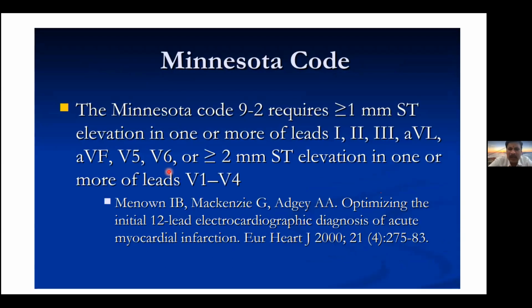So how do you take a diagnosis when there are chest leads? When the ST elevation is more than 2 millimeter, it is significant, right? Another carry-over message: in chest leads, more than 2 millimeter is significant. In limb leads, more than 1 millimeter is significant, right? If you understand the basics, then it becomes an easier job.